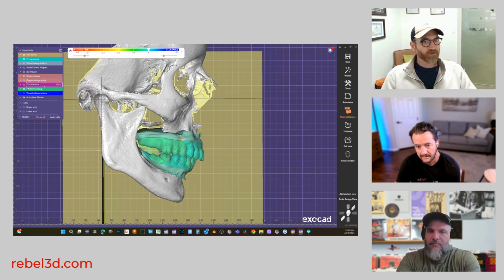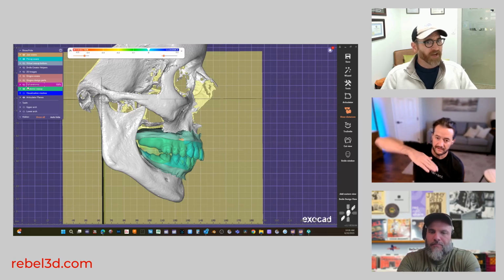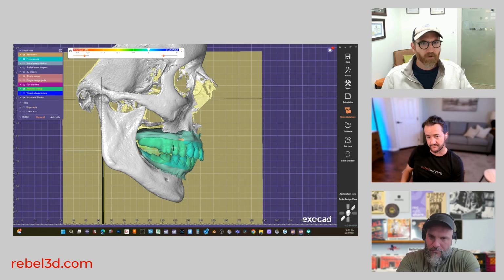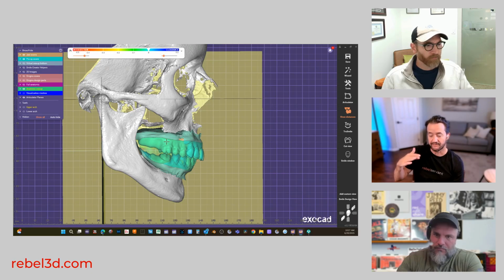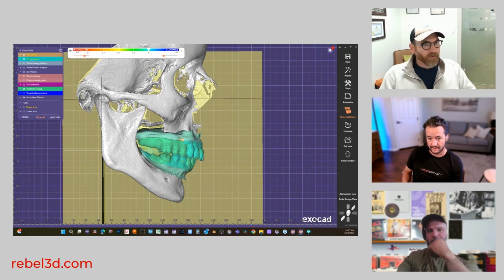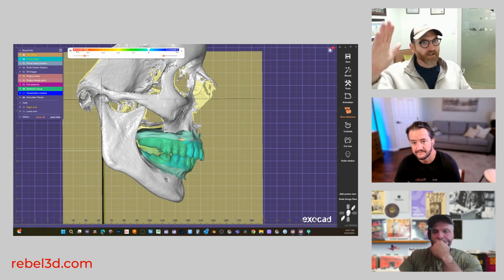Then everything is arbitrary. But that degree, though, I don't know what Camper's plane is, the degree that is sort of tilting down. Yeah. In the absence of this condyle position information, Daniel has no reference of what that angle actually is supposed to be, right? The only reference that he has is the photos.